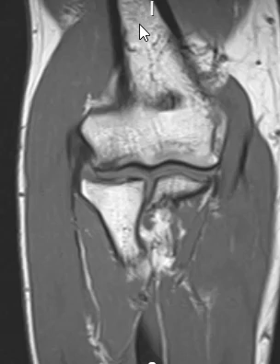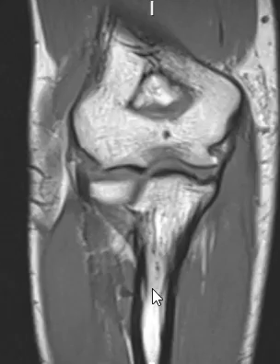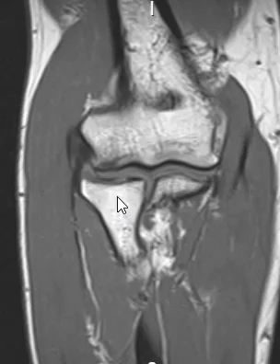This is the humerus coming down. We have the trochlear articular surface here. The ulna articulates on this side, and the articular surface looks nice. Again, here's the ulna. Along the lateral side, we have the radius, radial head here.